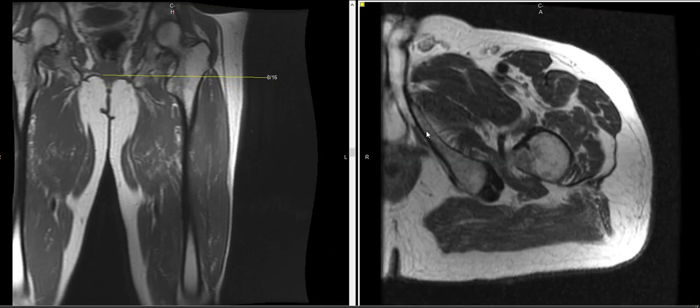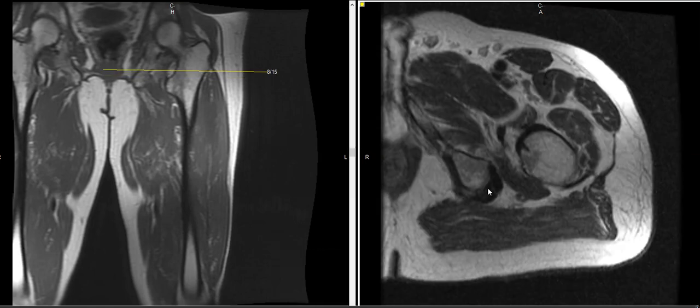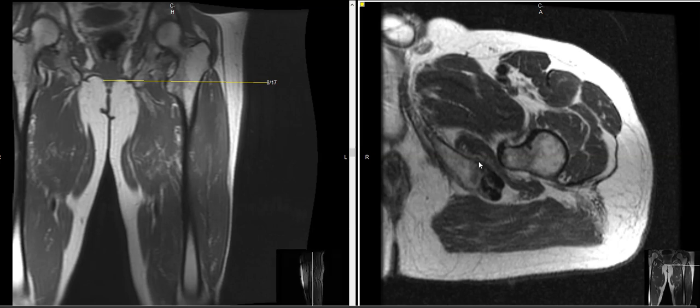Now there's another bone over here, the ischium. And here's the hamstring tendon origins. They look dark. This is the ischial tuberosity where it flares out and is wide here, where these attach. And we notice that there's a problem right here. There's a muscle called the quadratus femoris muscle. It goes right in between the lesser trochanter and the ischial tuberosity.